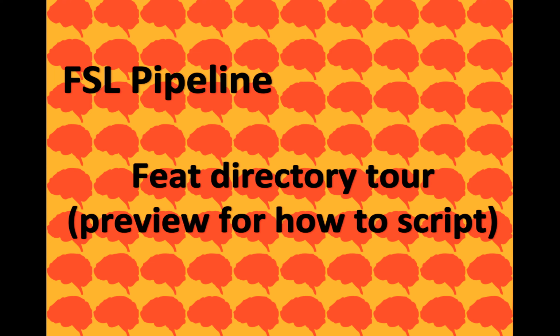And if you recall, for this subject, and most of the subjects in this DS008 dataset, they didn't have outliers because they're not little kids, they're not old, they're 20 and 30-year-olds, and they tend to be pretty good about their motion. So not everybody will have anything in there, but it creates a copy of the file. This will only be here if you put something here. We did put something here. It was an empty something, but it was something, so there's a copy of it.